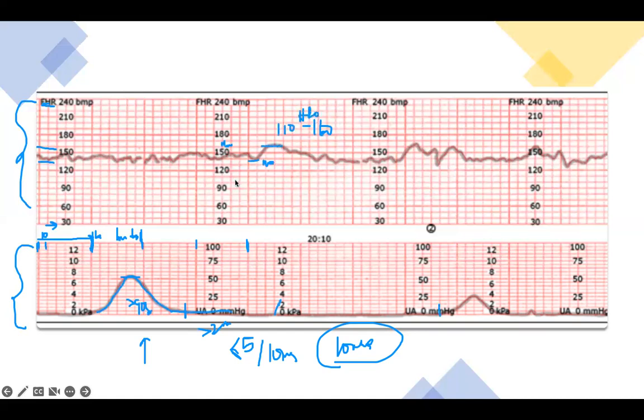And that's all. You're looking at whether, with the contraction, and then the second one, something happens. So this is the contraction going up like that. There's nothing happening to the baby. You see variability. There's no deceleration. That means the heart rate doesn't drop, it's within the baseline. Then you go up a little bit. Going up is good. It doesn't drop all the way down. As the contraction starts, I don't see any deceleration. So this is a normal strip with normal variability.